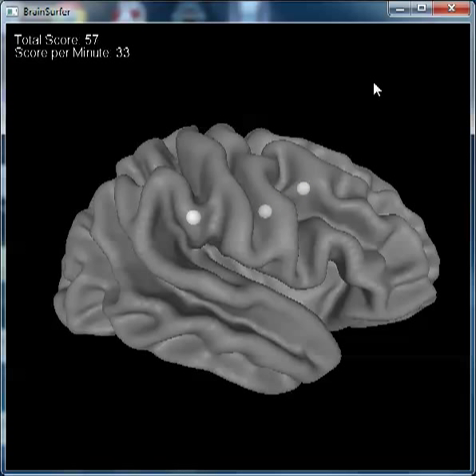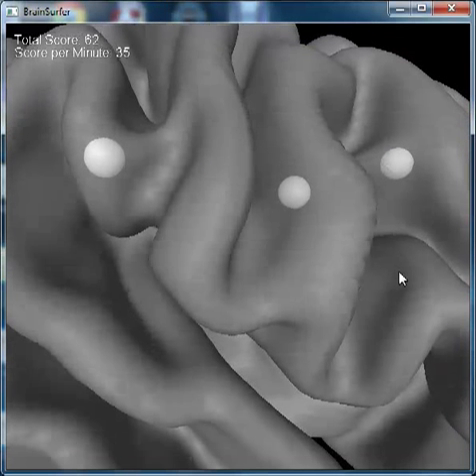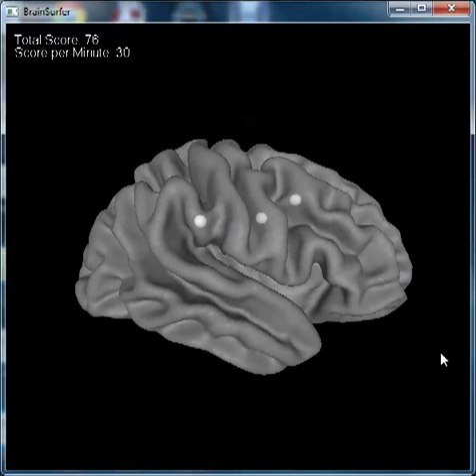Now we can zoom in on these regions, and through biofeedback and brain-computer interface technology, train these regions to become more stable and exhibit less dysregulation per unit time, and thus improve the efficiency and speed of information processing in a network that's relevant to the patient's symptoms.